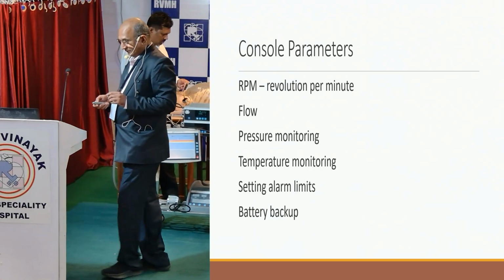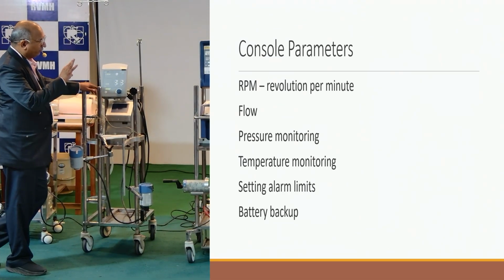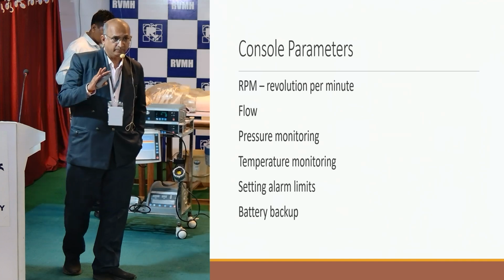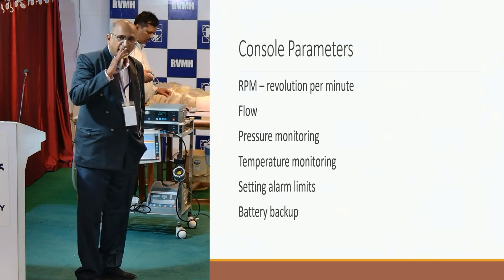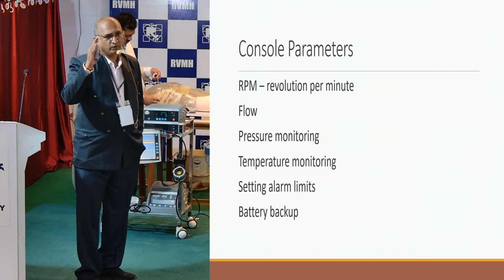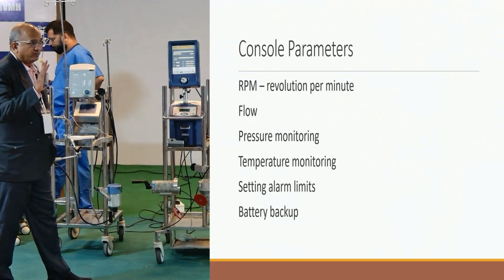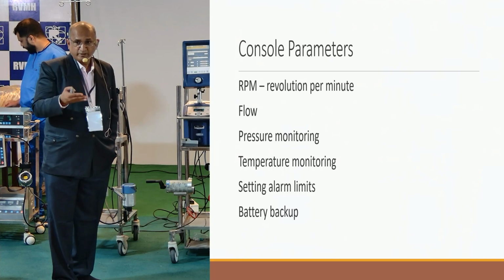Okay. Fine. Other point is you can set the alarm limits for each of them. Machine has got alarm limits, and each machine has got battery backup. Okay. So there's a battery backup in each machine, which might be for half an hour to 1.5 hours. Some machines have got 4 hours battery backup. But again, remember this battery backup. It is important because of your transport, definitely.